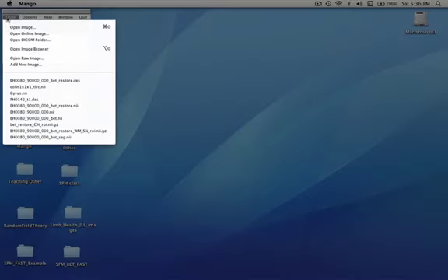the one that you need to get most familiar with initially is how to open images. There's a standard opening approach where this brings up a directory and you select a file. The second item is to open an online image. You'll be asked for a URL to do this. The third one allows you to open a DICOM folder.